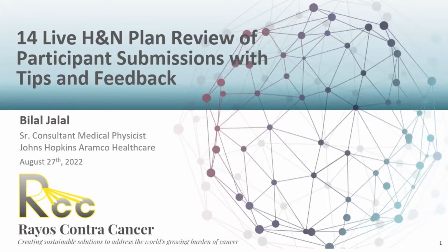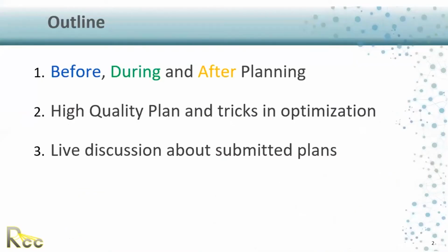Basically, this is my outline. I hope you can see my screen. Can you see my screen? Yeah, we can see your screen.